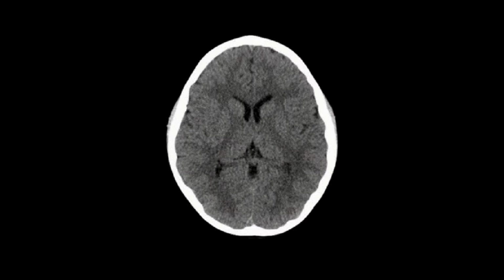So as I said earlier, the gray matter consists of densely packed cell bodies. So they're highly dense. While the white matter, on the other hand, is principally just myelinated axons. And so axons are nothing but nerve fibers which are covered by sphingomyelin, which is a type of fat. Fat, as you guys know, compared to cell body, is going to be less dense. So the white matter as such is less dense compared to the gray matter.